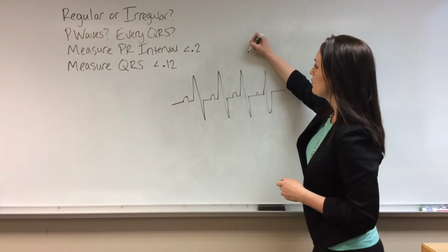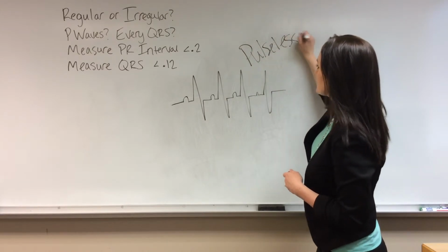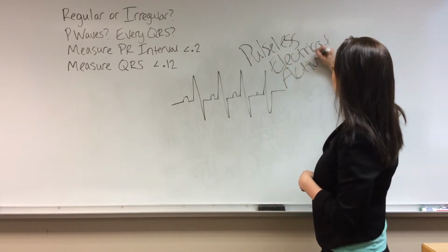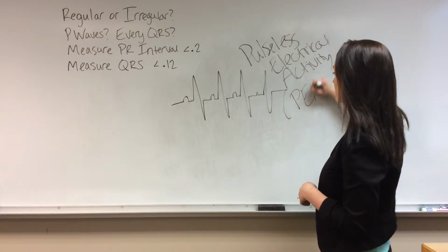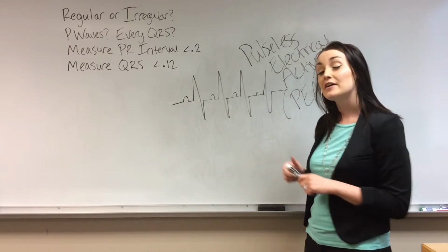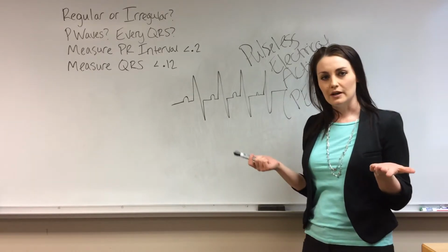This is what we'll call pulseless electrical activity, or for short, PEA. To me, as a nurse, as an ICU nurse, someone familiar with rhythms, this is the scariest rhythm to me. And the reason is, it looks normal on the monitor.